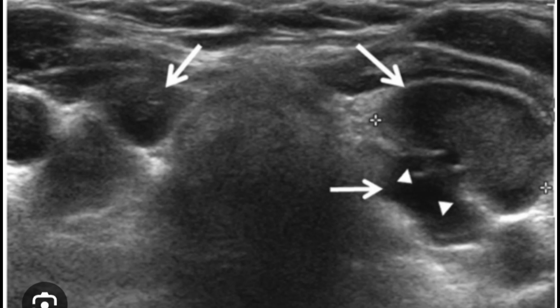In U5 malignant nodularity, you will see that the nodule is associated with multiple lymph nodes. Here in this image you can appreciate that the thyroid has a hypoechoic nodule, and in the surroundings multiple cervical lymph nodes can be seen. As you all know, cervical lymph nodes can be categorized into anterior triangle and posterior triangle, but beyond this, a very fine example is that they should be categorized as level 1, 2, 3 or 5 nodes.